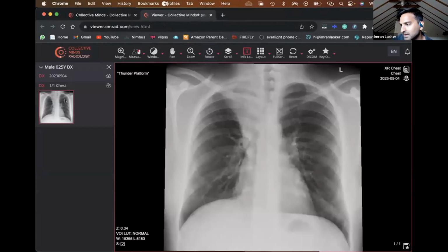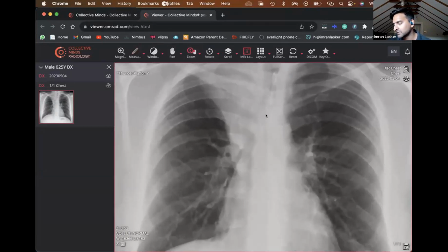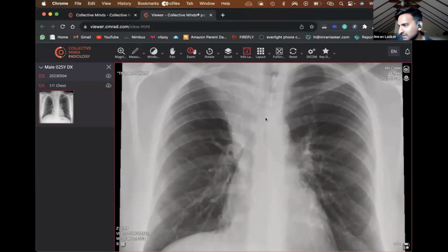So this is case number 2. And hopefully this is slightly more straightforward. I think we've done something like this in the past with just another example that came up. So again, this is an adult patient. We can't see any evidence of any non-fused ribs, non-fused bones.